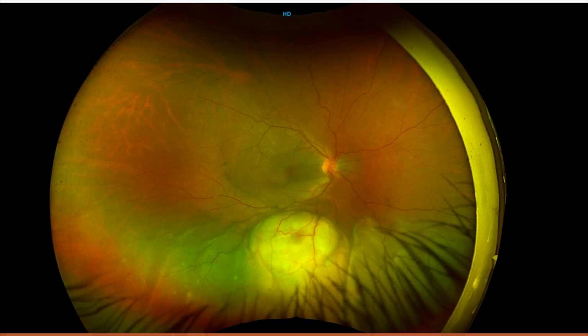Okay, next. Anything else on that fundus photo? Anything that you see on that fundus photo? There's something on the mass. What is that? Describe the mass. It's yellow. It has an RD. It has something else. What do you think is there? You see those vessels looping, they go down. A lot of these granulomas have retinochoroidal anastomosis, right? Probably that's what it is, I haven't seen the patient, I'm guessing.